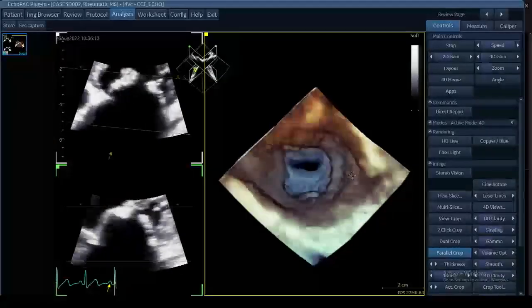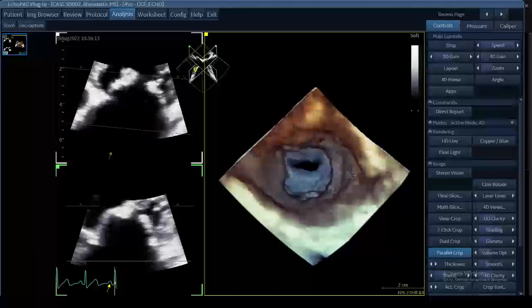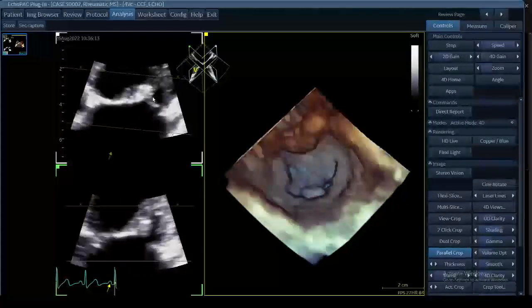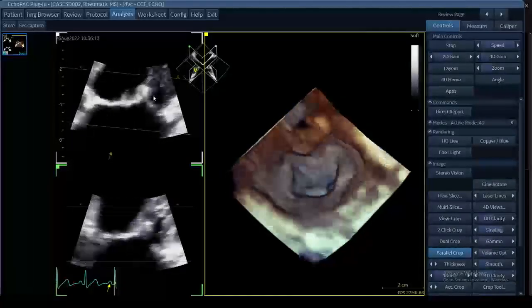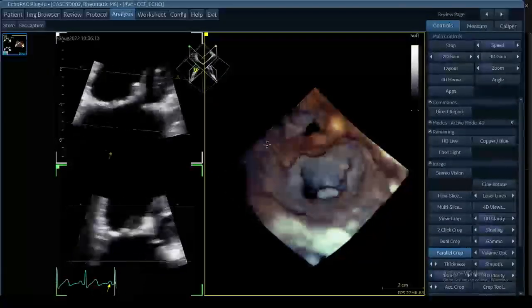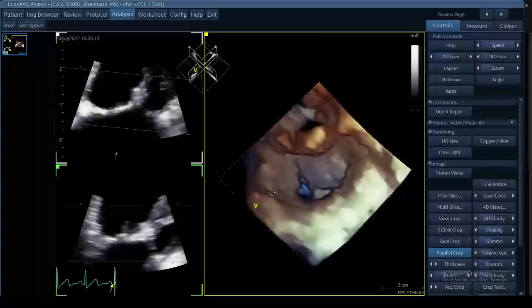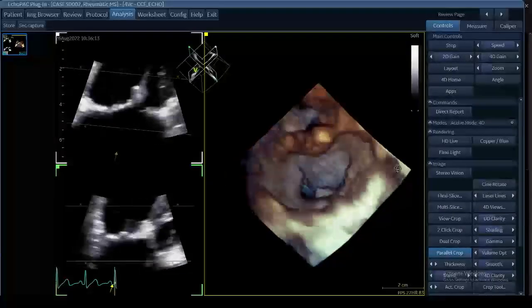The way that I choose is often dependent on whatever's going to get me a prettier looking picture. A lot of times on surface echo, the ventricular aspect of the valve is closer to the probe. And so our ventricular image will often look really nice, compared to our atrial image. Here, both of our images look very nice. You can see I'm in an atrial view right now, and you can see that diastolic doming and the thickened leaflets.